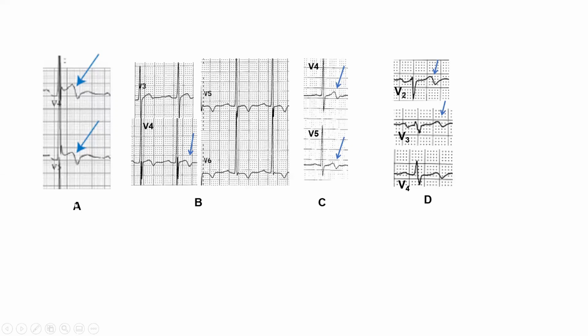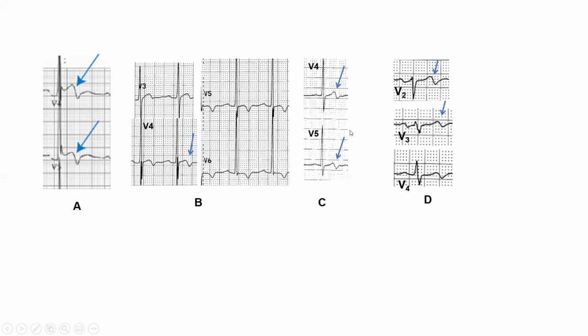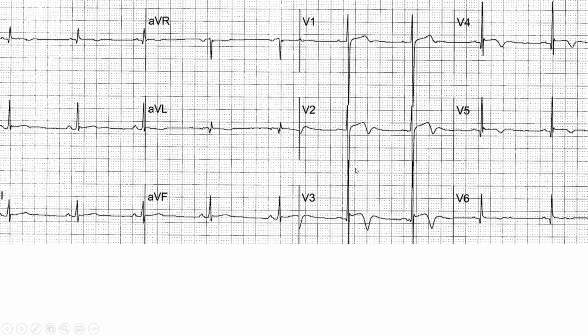Case 1A here, you see this morphology. Anybody can tell me what this is, and you can put it in the chat box. So this is a patient with ST elevation and fairly deep and fairly abrupt biphasic T wave. But look at the ST, it is more elevated than in Wellens. And this is something I showed last week. This is a young black man who's asymptomatic. This is another EKG I showed that week, but it's a similar morphology, that very common morphology in young black men, the early repolarization variant. So this is not Wellens.